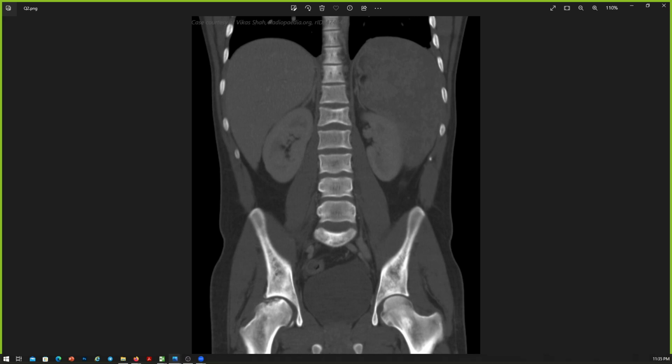Could you please point out the findings once again? You have the control. Okay, so generalized diffuse sclerosis, heterogeneity in the left iliac. We actually cannot see your screen, see your cursor. So could you please control the mouse? I've given you the option to control. I have the option. They said it's with me. Just click on the image. Yeah, now you have it. Could you please point out which vertebra looks biconcave to you? Okay, that one.